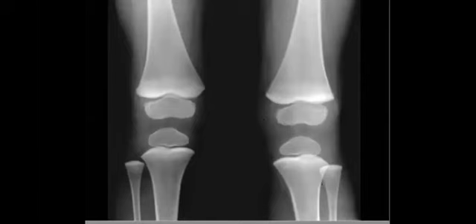Treatment of leukemia. Treated rickets. And it can be treated, yes. Neuroblastoma metastasis is not common, because we mentioned neuroblastoma is more with lucent appearance, but yes, it can be. With lucent appearance more, it's permeative lesions like we showed you in the previous one.